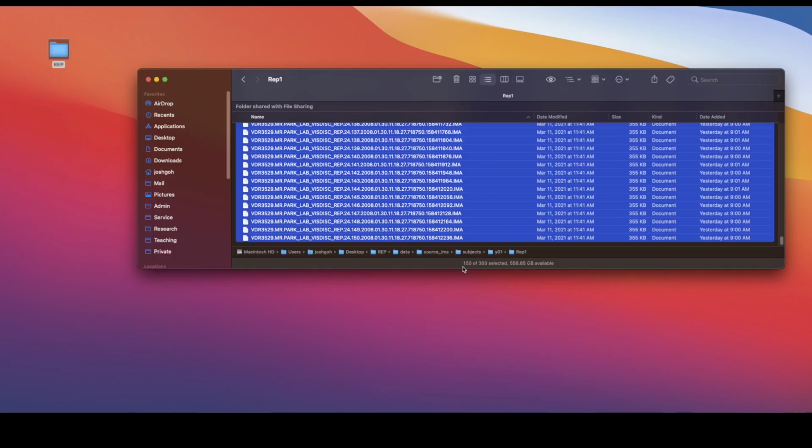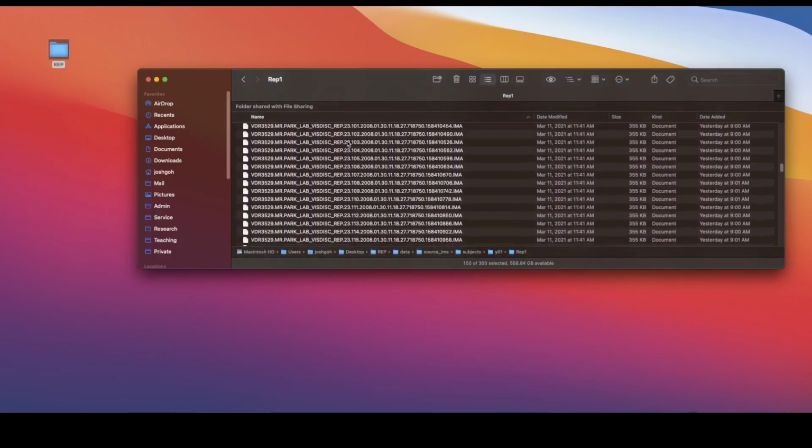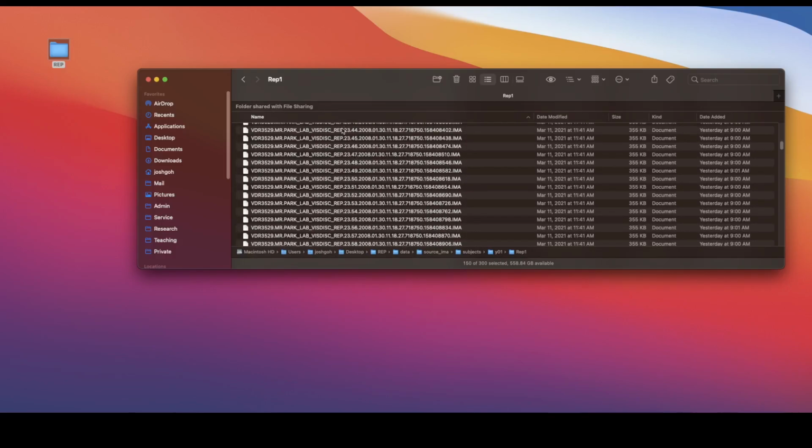For the purposes of this class, we are going to ignore the subsequently generated, Siemens-generated sequences. We will only use the original sequences. So for all rep1 data that you will see for all subjects, make sure that you always select the earlier sequence number in that folder.